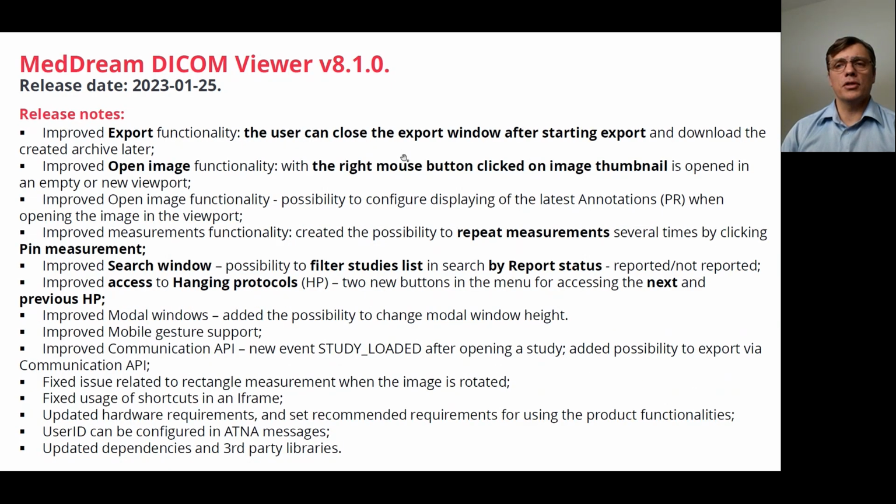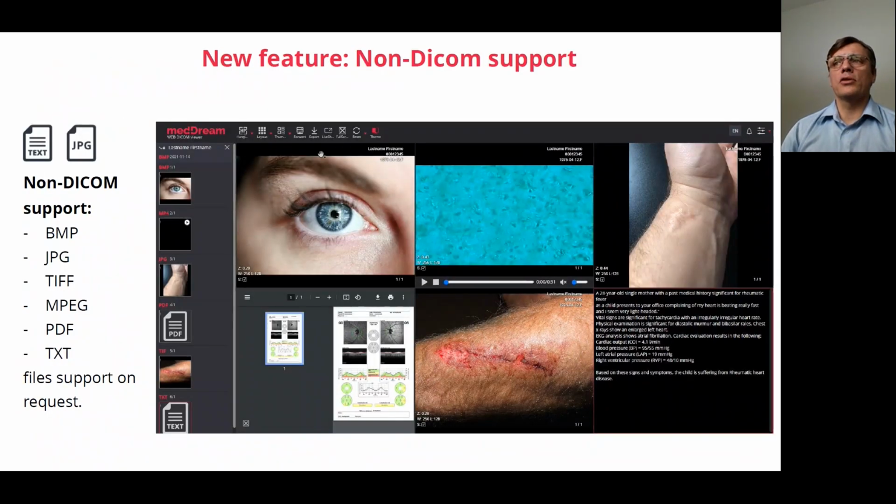As you see, the changes are a lot of lines. So it's a really huge release which is coming, and it's not only functions but also improvements in speed, and some issues are fixed also. So this is a very big change, not only in the visual part but also in the backend, which you can find in the detailed list of new releases. So now we're coming more to the visual functions, which you will see.